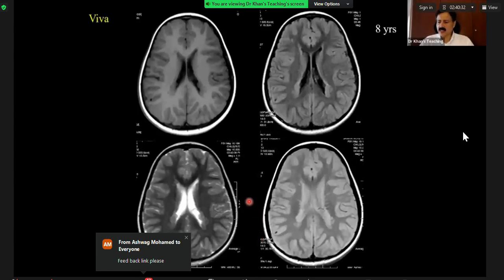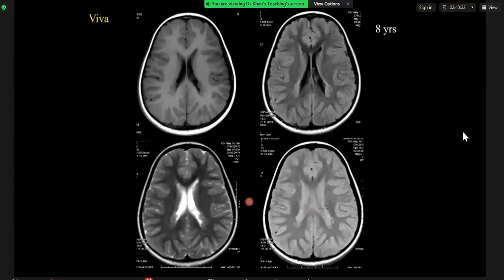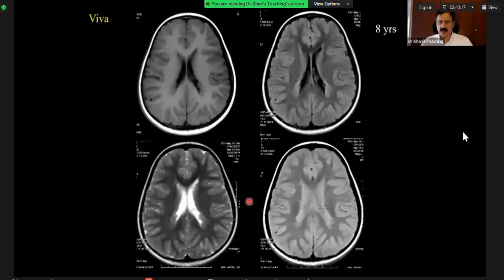Right. So first of all, in the exam, don't use this word SEGA. SEGA, you know what is a SEGA. You just use the whole word, whatever you want to elaborate. Second thing is that anatomy-wise, you are not seeing the foramen of Monro here. So you can say that I'm not seeing the foramen of Monro, but here this is not the location for it. But the key thing here is that I had put this case intentionally because this is what has happened in the exam for many students in the past.